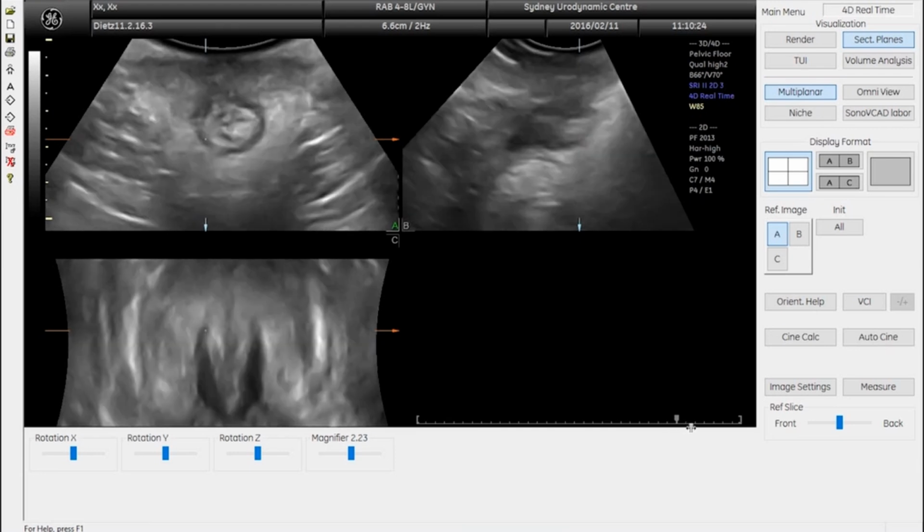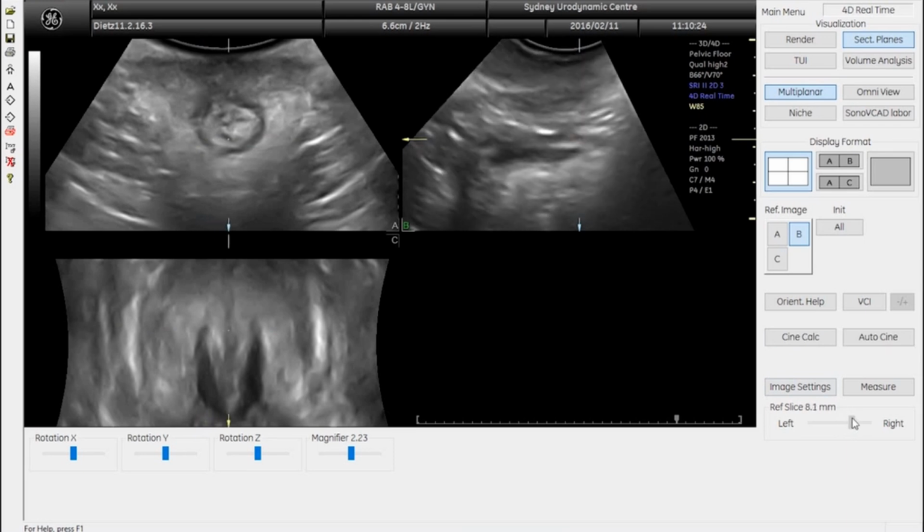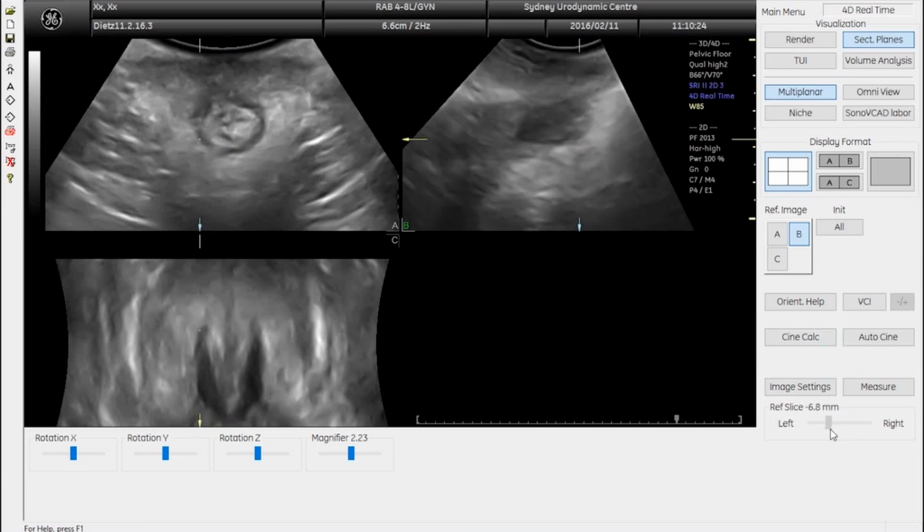That is to distal, that's to proximal, so somewhere around here. It also has the advantage that we can already pick up the fascial plane here. Let's select that plane and see whether the fascial plane is any more obvious anywhere else. Well, it seems to be here, and it's a lot more obvious here. So ending probably about here, because that is the longitudinal muscle of the anus. So the sphincter should be here and there, and you can already see that there's an area where there's obviously quite a bit of external sphincter missing.